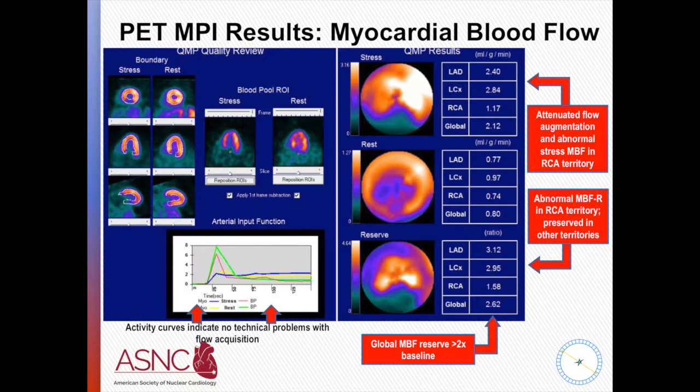Often in cases like this, we would not start the patient on Brilinta or Plavix because we really don't know whether we're dealing with multi-vessel disease or not, and we don't want to get the patient locked into a long-term, week-long wait for surgery, for example, in the event of multi-vessel disease. But here we can be very confident we're dealing with just single-vessel disease. It would be very appropriate to prep this patient with Brilinta before heading off to the cath lab.